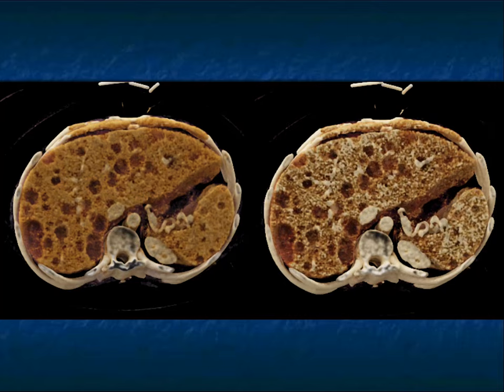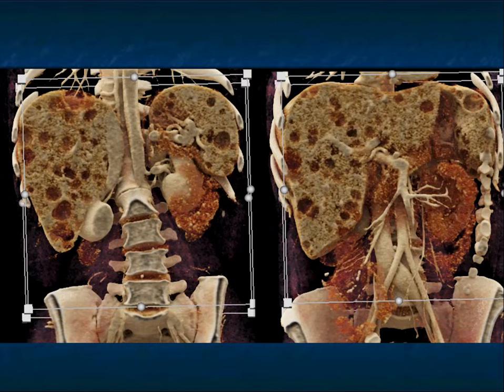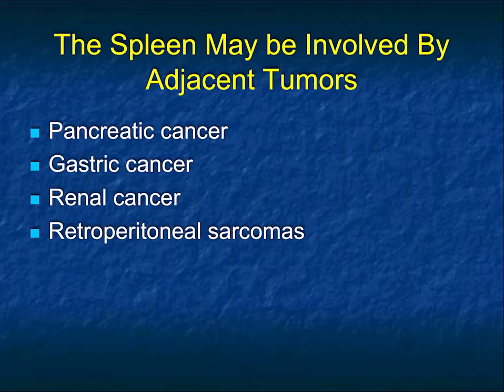So just a really nice example of the extent of disease. Again, if I saw this case, no history, I would say metastasis, I would say lymphoma, I would say sarcoidosis.